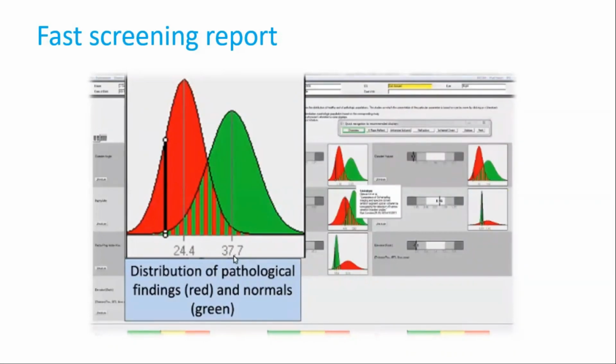I already understand that. Yes. What I'm trying to ask you is that right now your black bar is on the extreme left dark gray zone. Left.